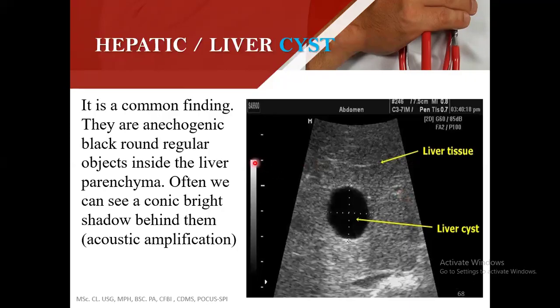So, let's move. When we get to fatty liver disease, yes, we will explain it. Now, hepatic cyst. This is very simple.